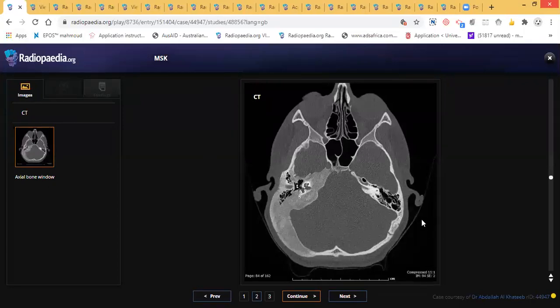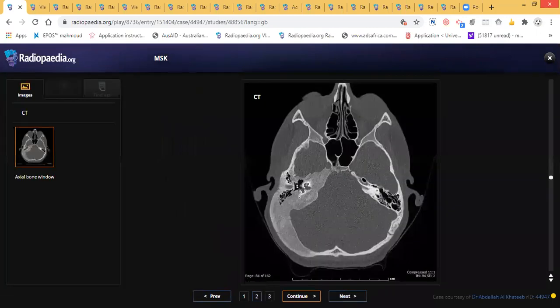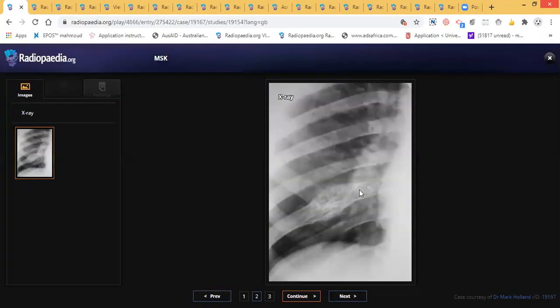So again, I think it will be easier now if you find this appearance with the ground glass appearance, which is typical. Yes, fibrous dysplasia, one of the giant titles in the exam. Then he will ask you many questions, maybe about the associated syndromes like McCune-Albright. We mentioned it in the neuro, McCune-Albright, and maybe this patient will come with many clinical features. So keep it in consideration, and Mazabraud with myxomas, exactly, if you find myxoma.